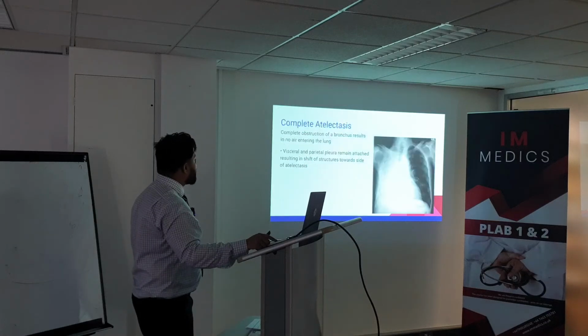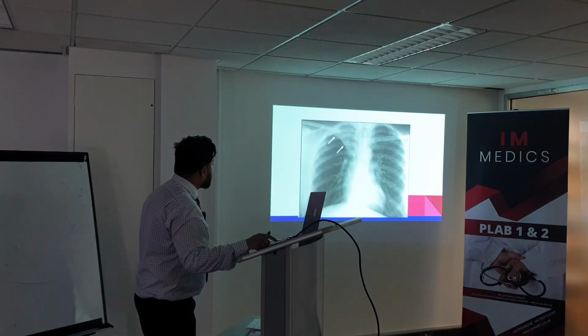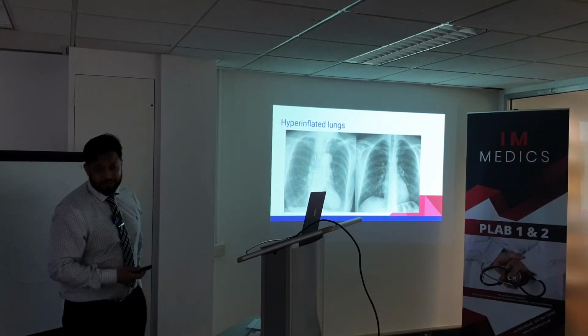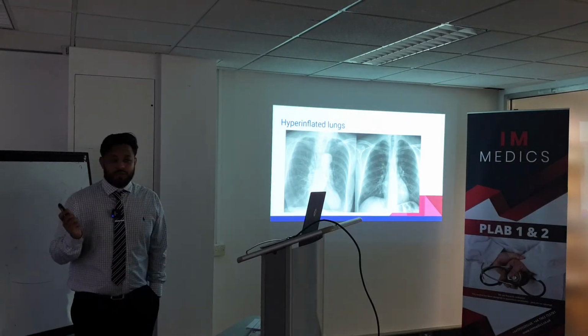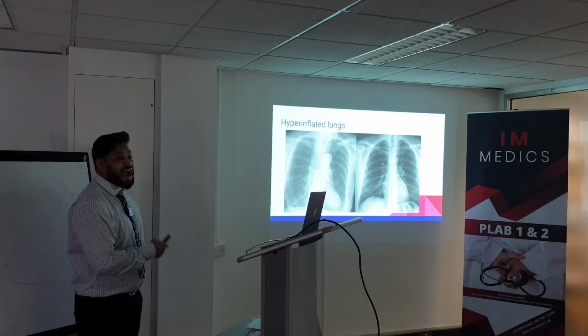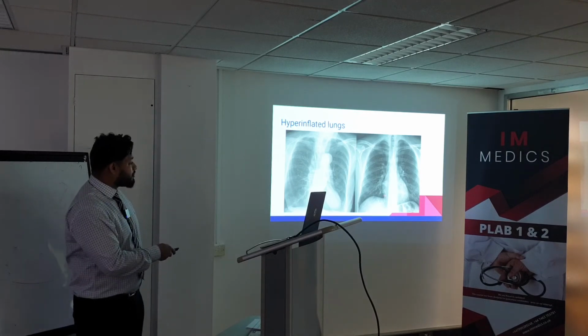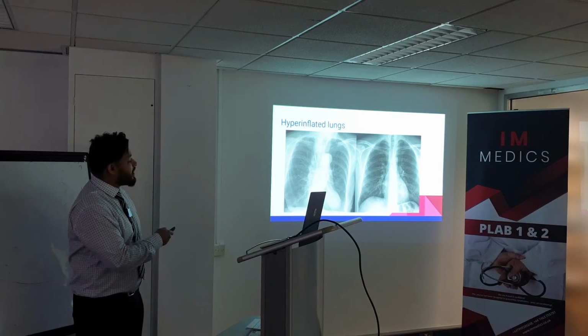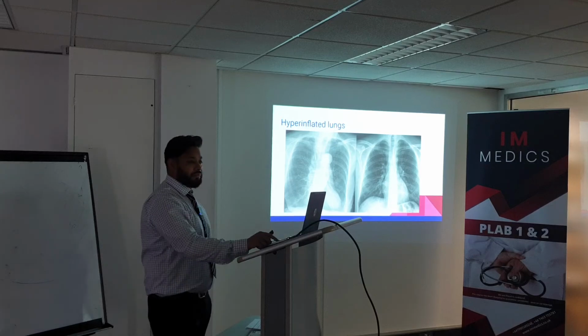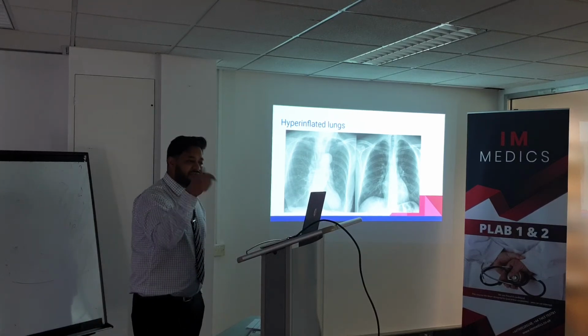Otherwise, everything else he mentioned, where's the pneumothorax picture? Okay, hyperinflated lung, yeah? Someone mentioned it, but you haven't seen it. Look at the diaphragm, straight, hyperinflated. So the diaphragm is meant to be curved like this. Look, it's straight. You said in PLAB 1 it came up, so look, that's straight. COPD. Yeah? So he said emphysema, emphysema comes under it.